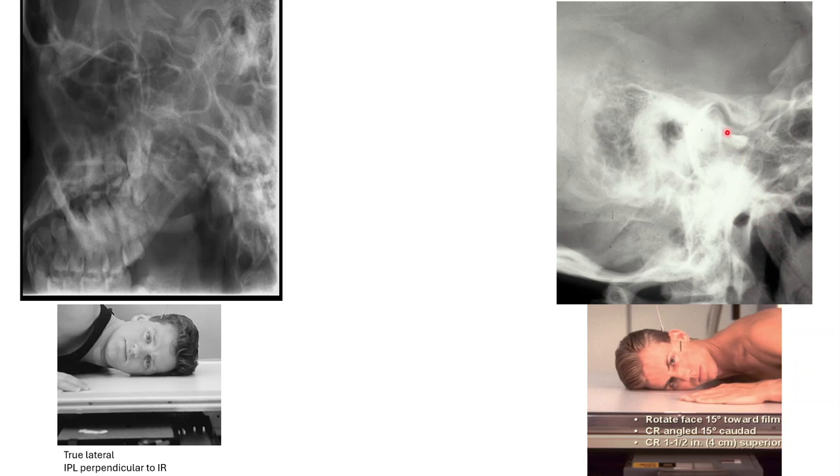All right, but we can clearly see that there's rotation here. So we would be able to identify this image without even being there when they did the x-ray. We can look at this x-ray and say, oh, that's a law image. We can also identify the EAMs here. Right, we can identify the EAMs, the separation of the EAM here, and the separation of the condyles.